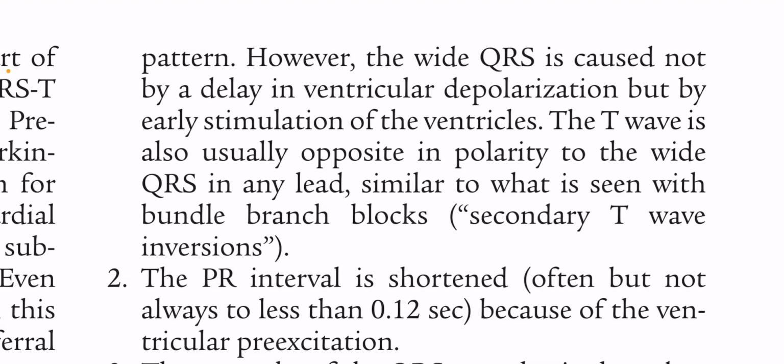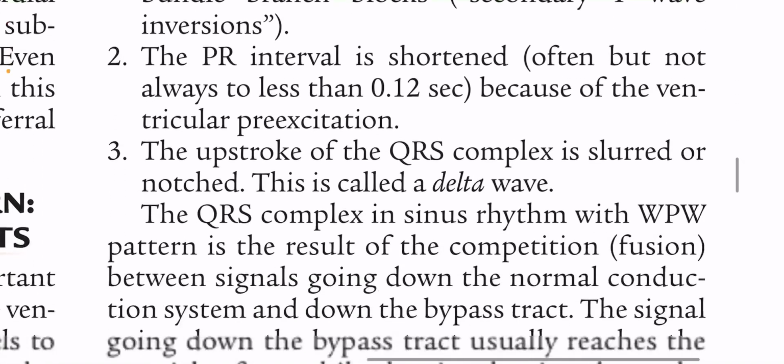Similar to what is seen with bundle branch blocks. That is secondary T wave inversion. The PR interval is shortened.